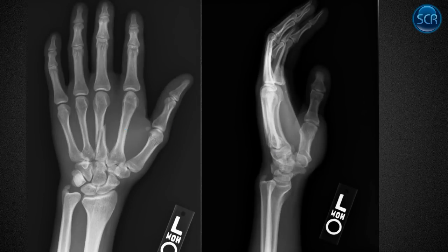Here's another one. You can see we've got a mid-shaft fracture of the third metacarpal. And sometimes these will displace straight up posteriorly or anteriorly, or may not displace much at all. So you need to make sure you're looking very carefully. Sometimes you only get that spike on the lateral projection. They have an ulnar styloid process fracture as well.